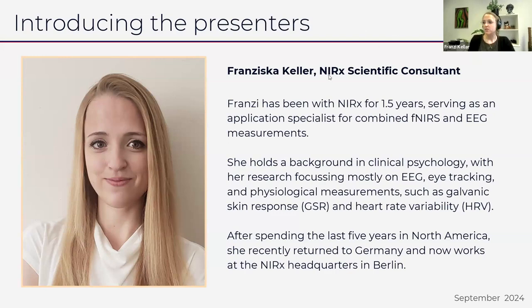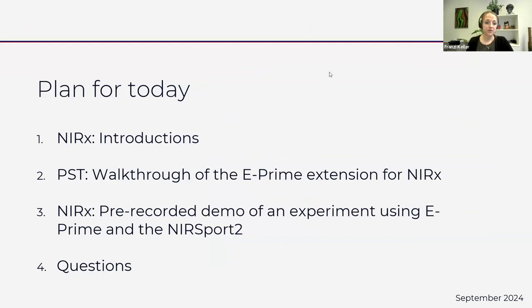Okay, so this was it for the introductions. And just because today's webinar has a couple more components than our usual webinars, I made this little outline slide. So the introductions we already got out of the way. Next, my colleagues from PST are going to take over and are going to present you with a walkthrough of the E Prime extension for NIRx, and they're going to click through the software with you.